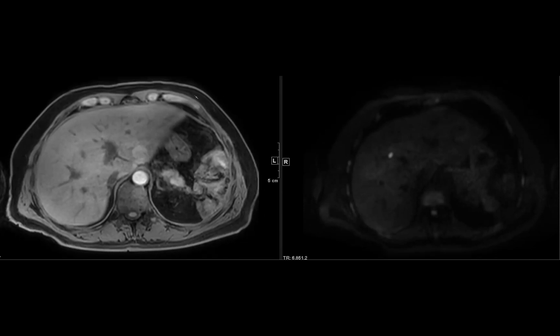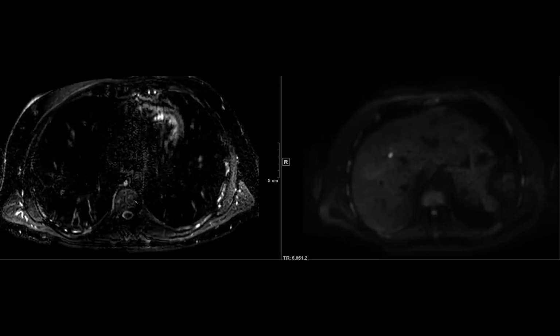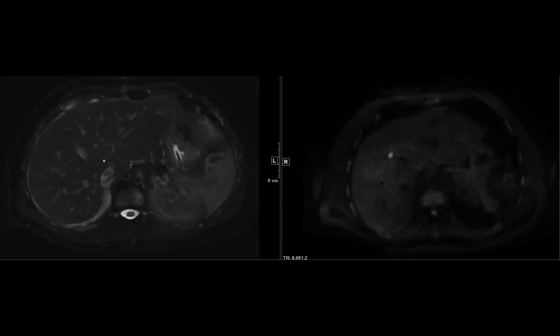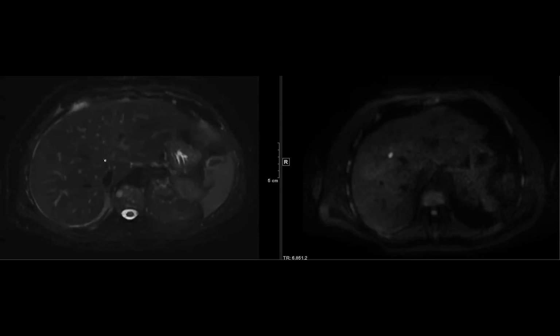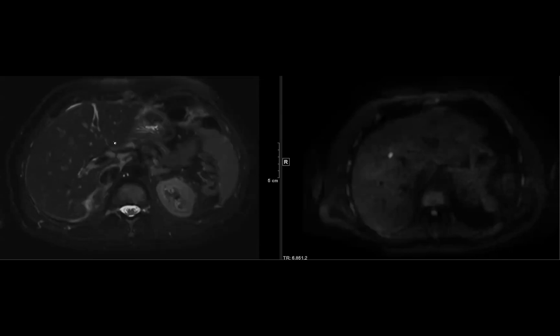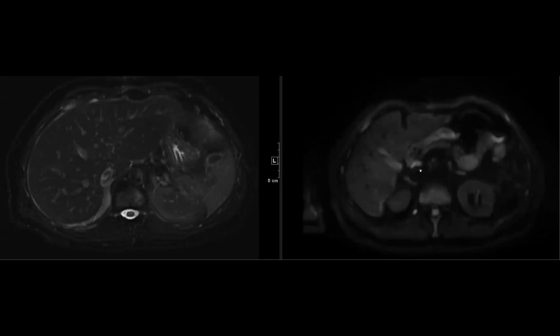Do you have the T2 on this case? I do, and it's not very helpful. The answer is I don't know what these are. It's more of a, do you have any better ideas than what I came up with? So you don't really see them. I'm concerned about that DWI. Me too. Right. So I'm concerned.